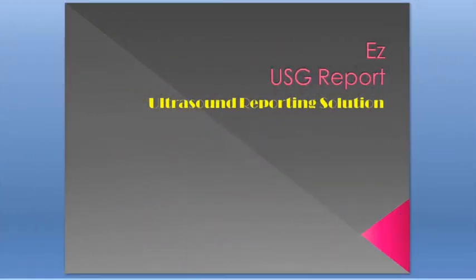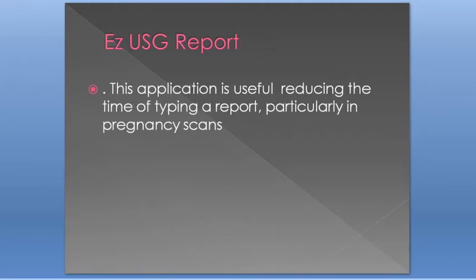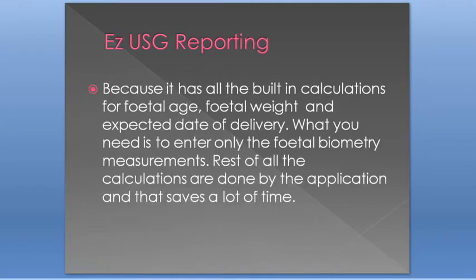Easy ultrasound report. Ultrasound reporting solution. Radiologists spend a lot of time dictating reports while typing. This application is useful in reducing the time of typing a report, particularly in pregnancy scans, because it has all the built-in calculations for fetal age, fetal weight and expected date of delivery.